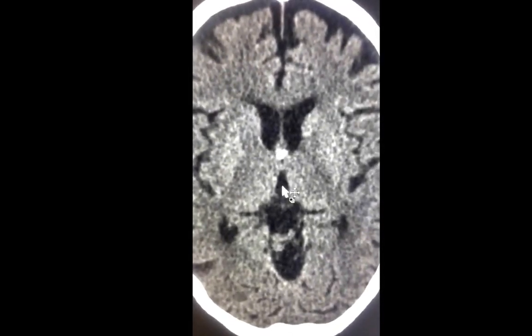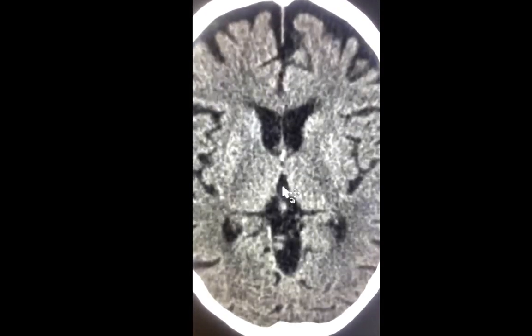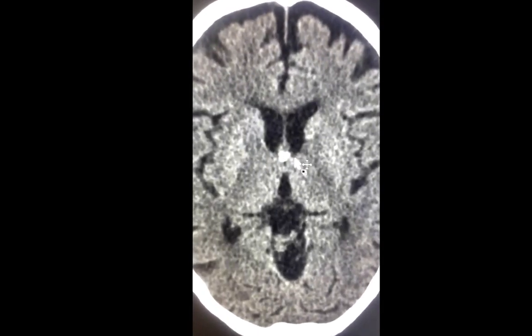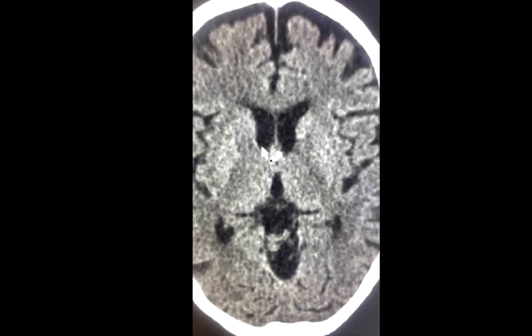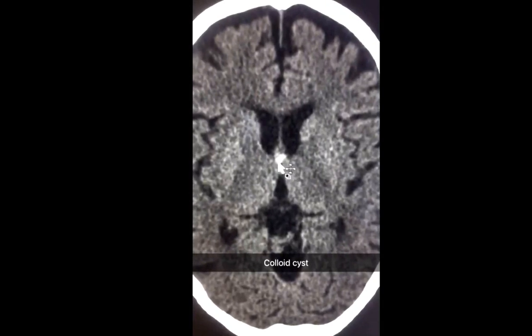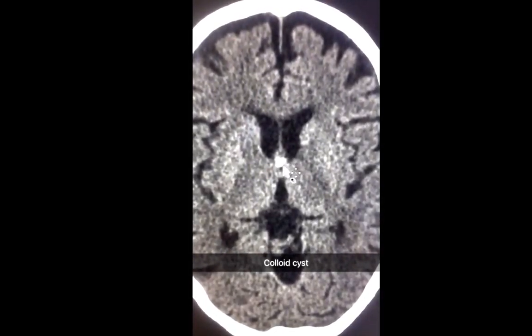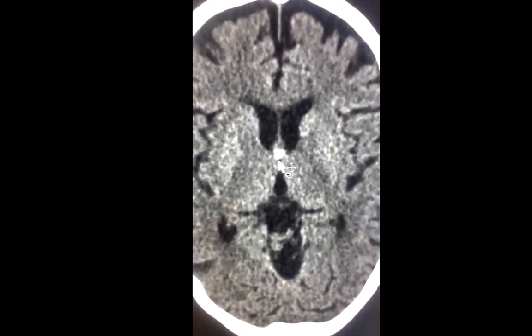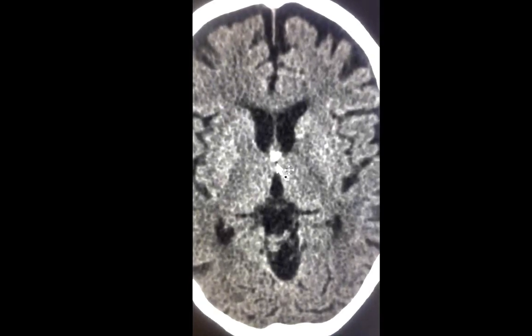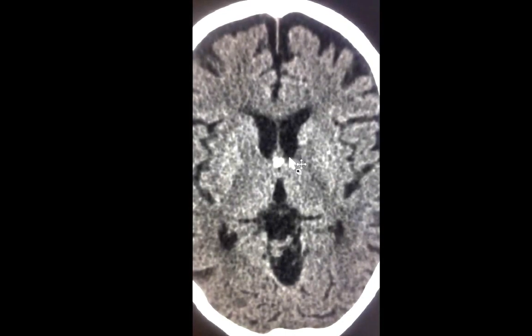So if this is not hemorrhage or calcium, what is this? Our senior followers have probably figured this out. This is a classic appearance of what we call a colloid cyst. A colloid cyst is a congenital benign cyst that classically occurs in the ventricle exactly at the region of the foramen of Monro. Such a cyst may be symptomatic if it grows, if it's large, or if it's mobile, secondary to obstruction of the flow of CSF and related hydrocephalus.